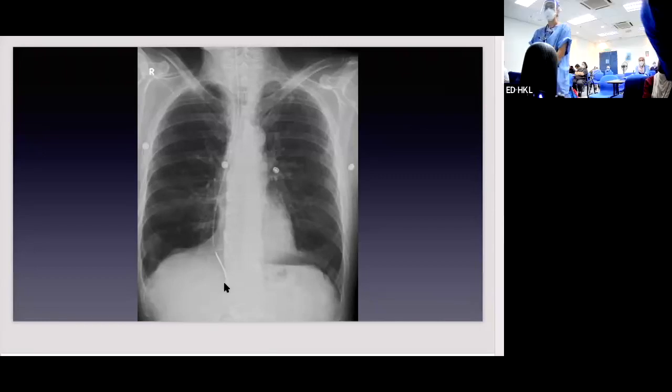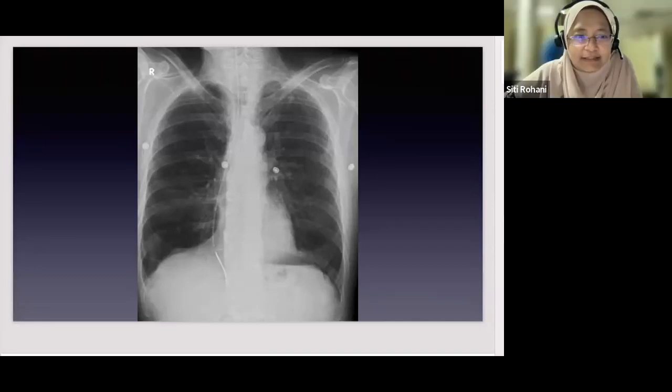Dr. Siti, yes, may I ask how old is this patient? 70.